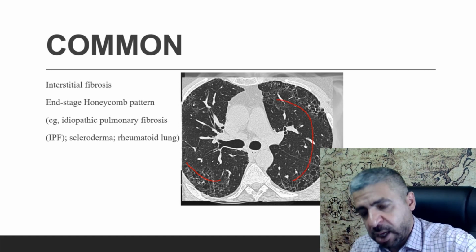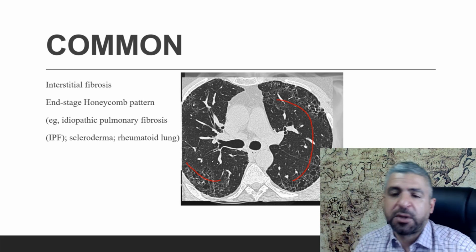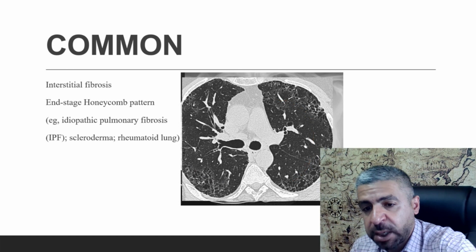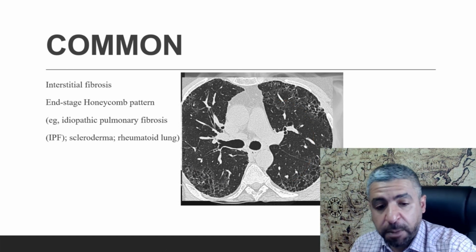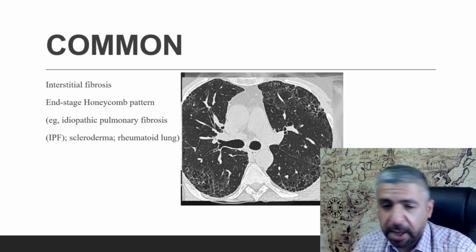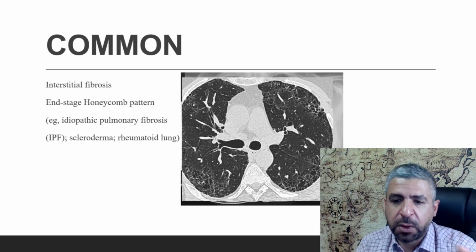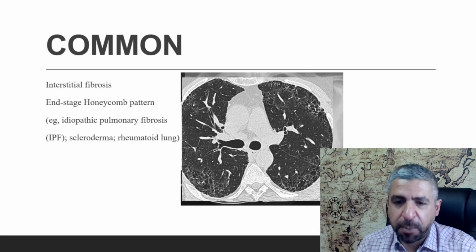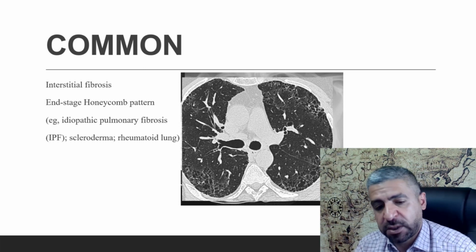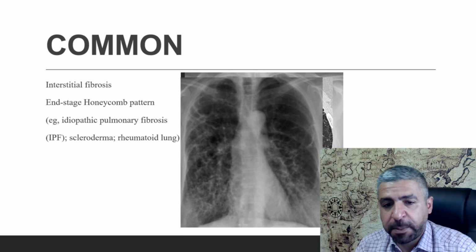the lung, and it's more prominent in the basal part of the lung. This is what we call an apico-basal gradient of honeycombing of idiopathic pulmonary fibrosis. Of course, honeycomb is a sign that can be seen in bronchiectasis also. In fact, it's well known for bronchiectasis rather than pulmonary fibrosis, but it's also seen in idiopathic pulmonary fibrosis.